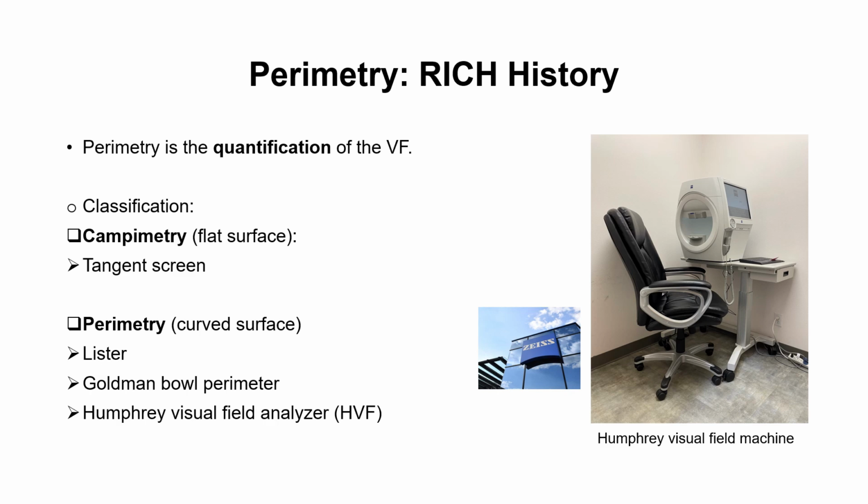However, the Humphrey visual field analyzer is automatic, static, and tests the central 30 degrees, and we'll explain this in detail in the following slides.